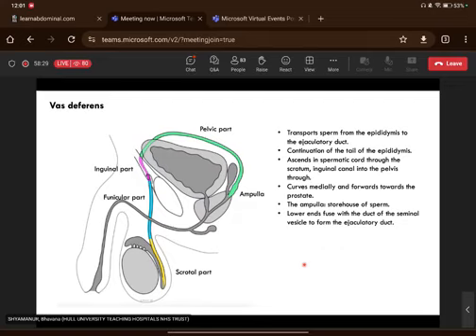As Tim said, one of the ways to do it is have a look at the shape. The vagina is opposed anteriorly, so it looks flat when you look at it on an axial slice. So what you'd expect to see is a thin rectangular flat structure between the urethra and the anus, whereas the prostate is more rounded, has a characteristic shape. You might even be able to make out a bit of definition between the transition and the peripheral zones on CT, but of course not as well as MR.